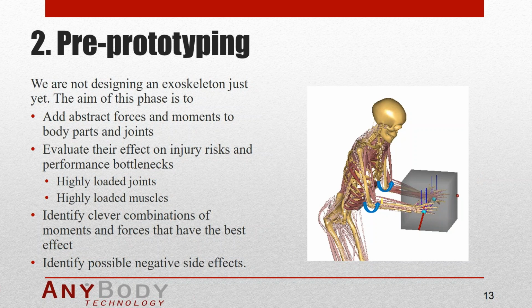Would we have to make actuators for the elbows and actuators for the shoulder, actuators for the spine, and maybe also actuators for the hips, because there's also hip extension involved here? Would we have to make individual actuators for all of those parts, or could we come up with a system that would in one go serve all of those different purposes? And the answer is yeah, I think so. If we think a little bit about it, we can possibly do something like this, which you see on the screen now. This would be a kind of system where, if this blue cable is in tension, then it will provide elbow flexion, and shoulder flexion, and spine extension, and hip extension all at the same time.